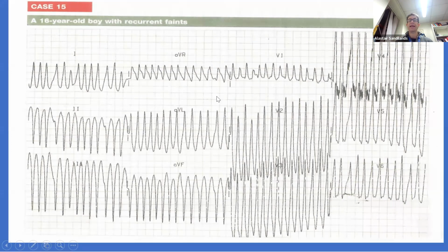In this situation, you electrically cardiovert the patient to make sure they're safe. You do not give them any medication that blocks the AV node, because then you'll send more of the signal down the pathway to the ventricles. Wolff Parkinson White, this is atrial fibrillation with pre-excitation. Pre-excitation is another word we use for saying there's the presence of a delta wave. Any questions?